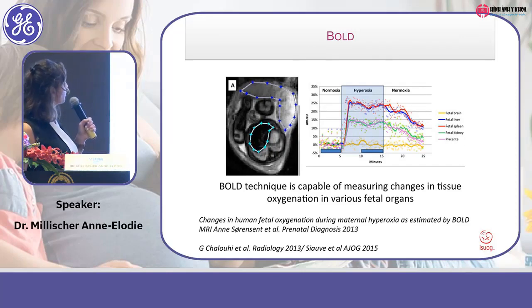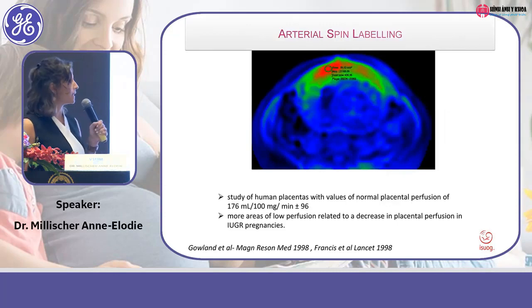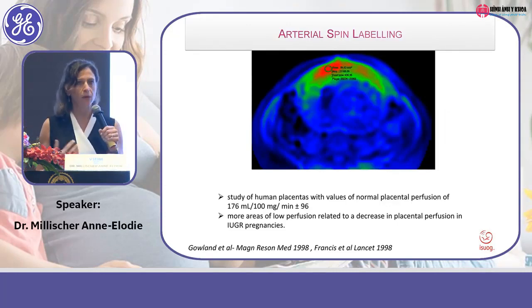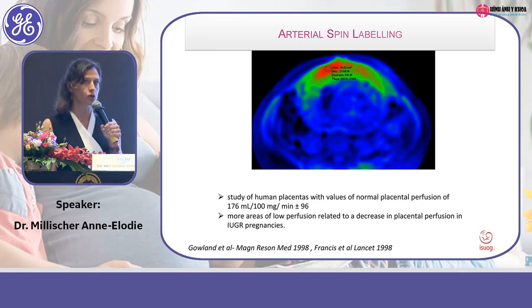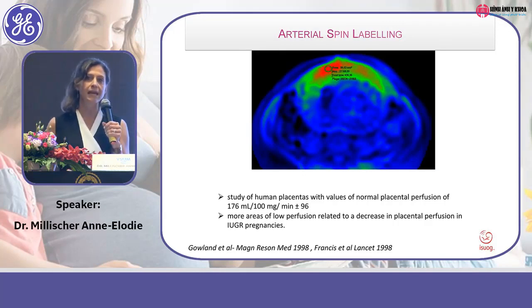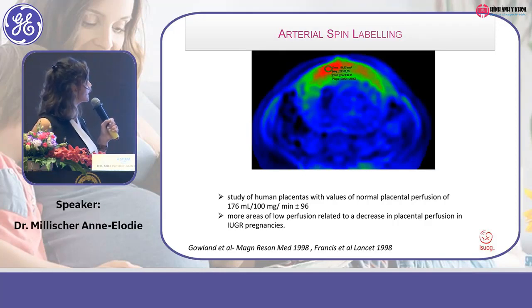And here you have the example of BOLD technique, and more recently, where it is a subject we are working on at Necker Hospital, it is this arterial spin labeling, and with this kind of techniques, we'll be capable to measure the perfusion of the placenta without adding any contrast.